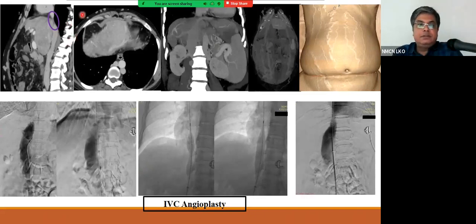So here on this CT image, sagittal reformatted contrast CT image, we can see there is short segment total stenosis, obliteration of the upper hepatic IVC with visualization of abdominal wall collaterals and marked hypertrophy of the caudate lobe. Here in the axial images, again, we can appreciate these collaterals: abdominal wall, perihepatic, paravertebral, and intramural esophageal varices.